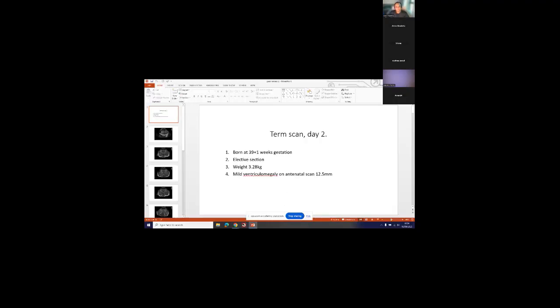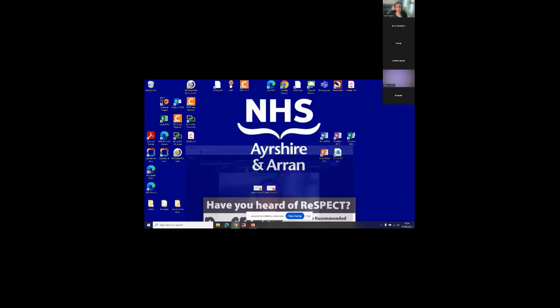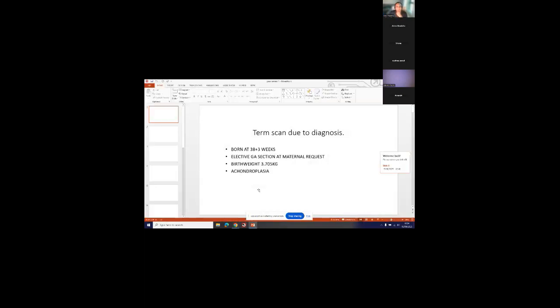Do you have another one? Yes, I do have another one. Go for it. Beautiful scan. Which is this one. Can you see that one?